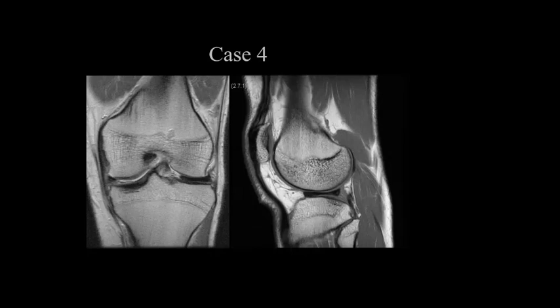So what are the problems with discoid lateral meniscus? Why is it important that we describe discoid lateral meniscus? It is liable for meniscal injury. Yeah, so it is prone to degenerate or tear.